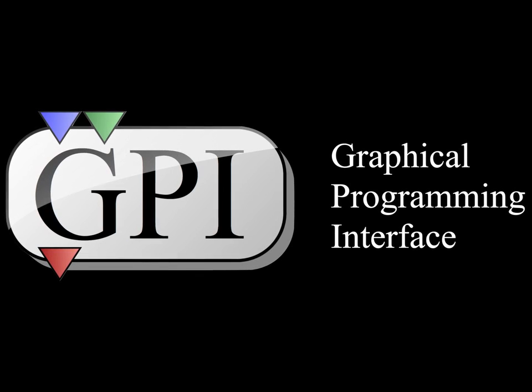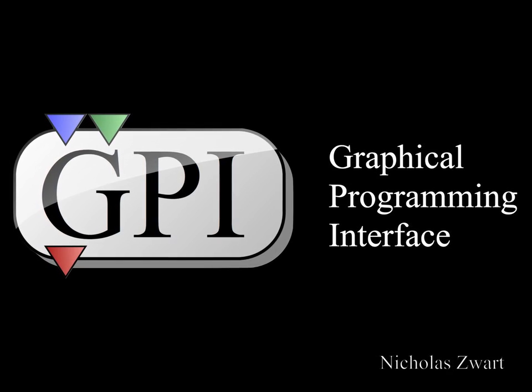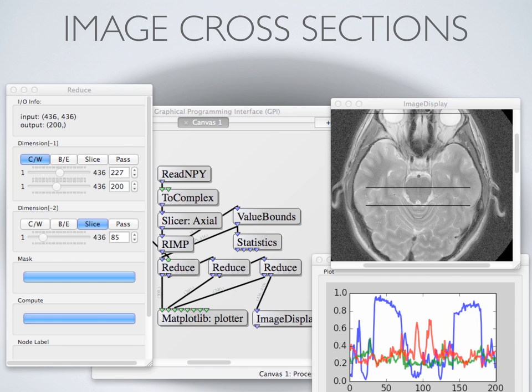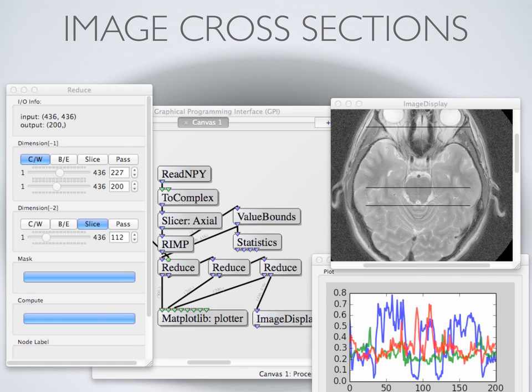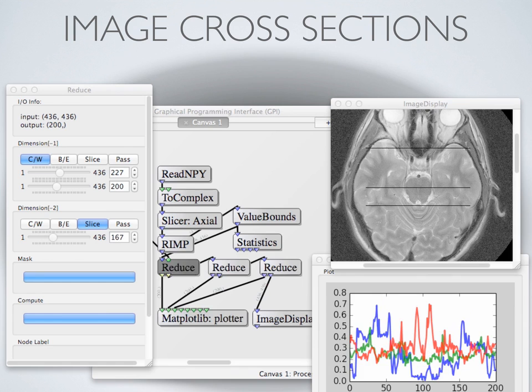Welcome to the first training module for GPI, the Graphical Programming Interface. I'm Nick Zwart, and I'll be guiding you through this exercise. Today we'll be looking at taking cross-sections out of an image, but this is really just a subset of a more common activity in GPI, which is data manipulation.